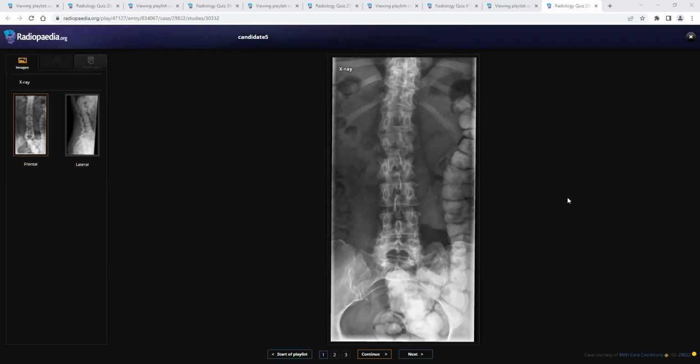Is there any history of trauma? Please ask for the control, and can you show me with your cursor? Can you see my cursor? I'm just looking at this level. I can see this abnormality over here, which appears to be a bit odd compared to the other vertebra. No, that's a facet joint. So I don't see any other abnormality.